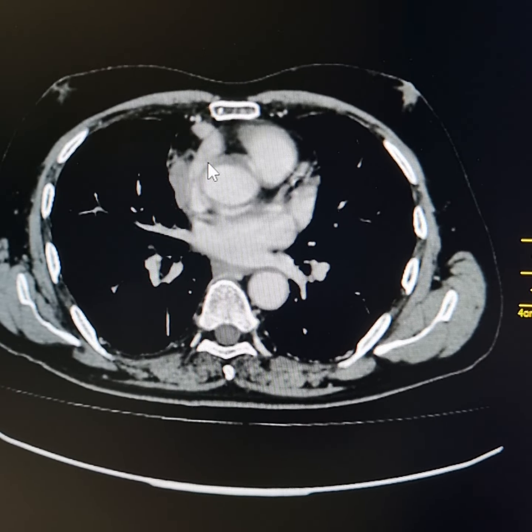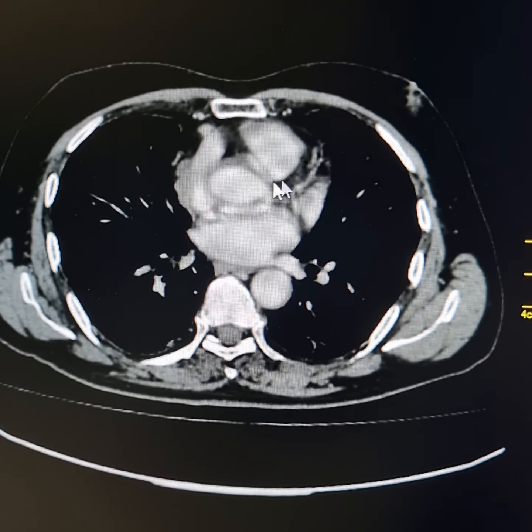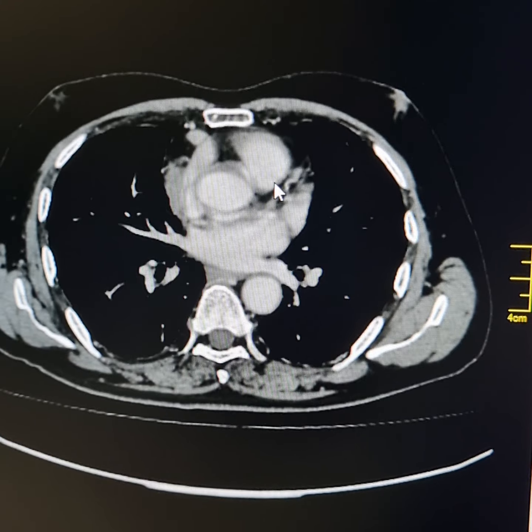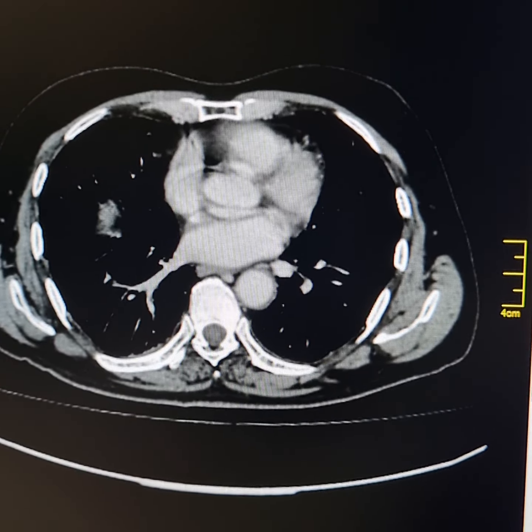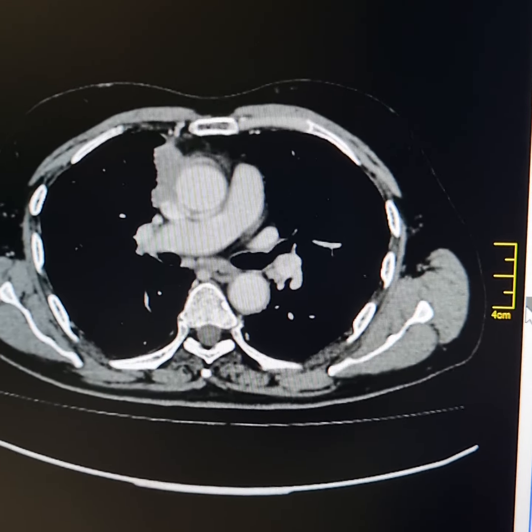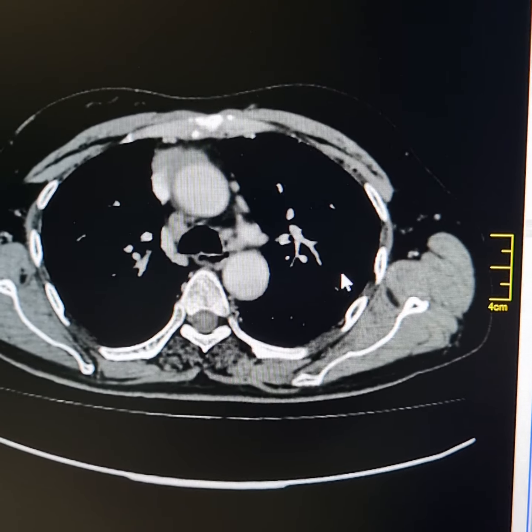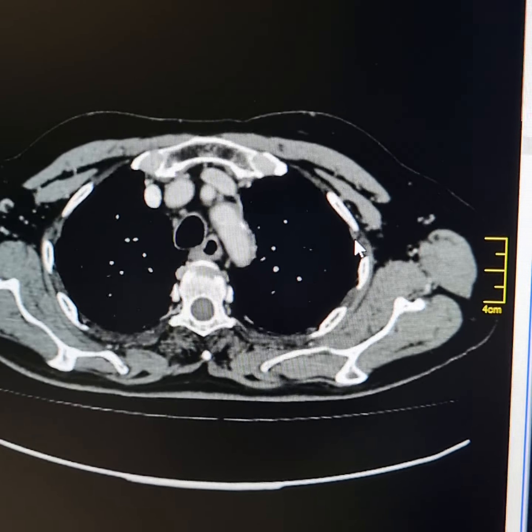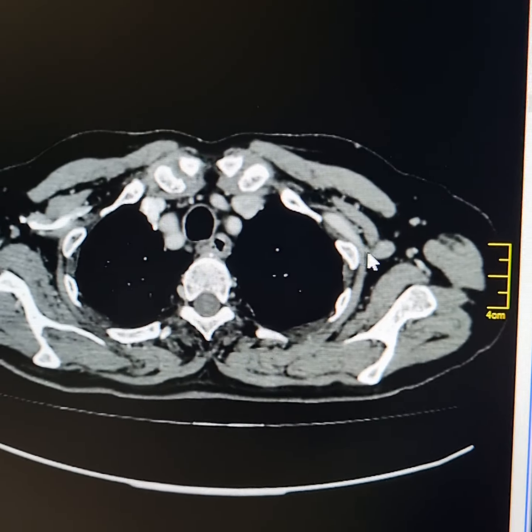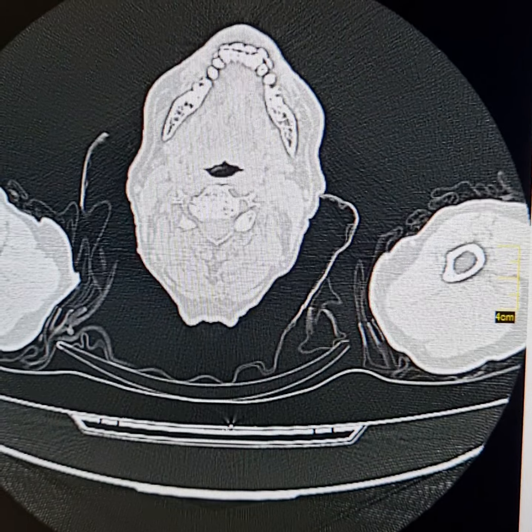the upper part of right atrium, where superior vena cava joins the right atrium. This one here. I will scroll it back again. Sub-centimeter sized mediastinal lymph nodes are present. These most probably are inflammatory in origin. Now I will show you the lung details.